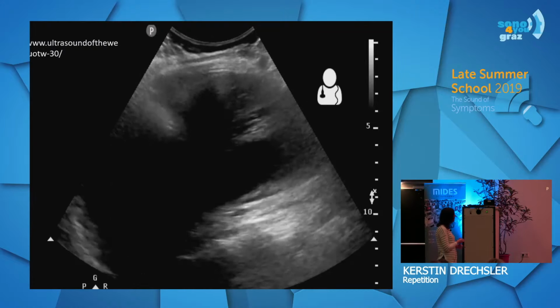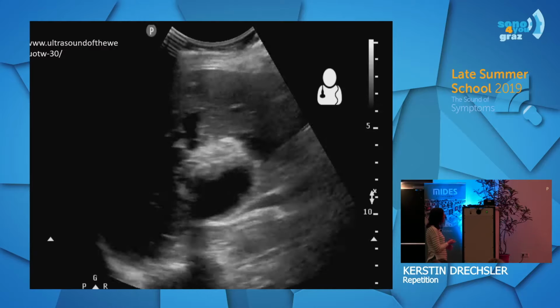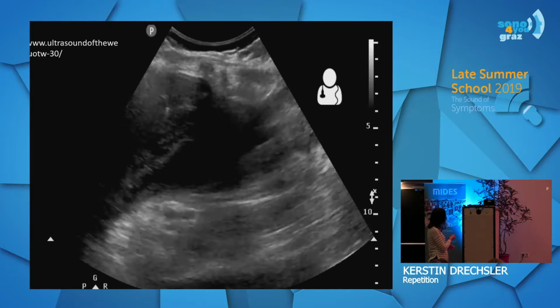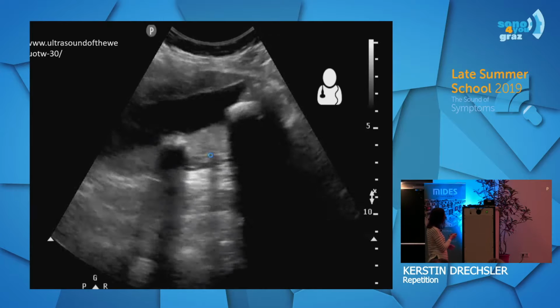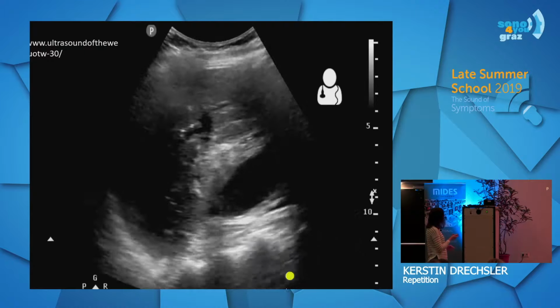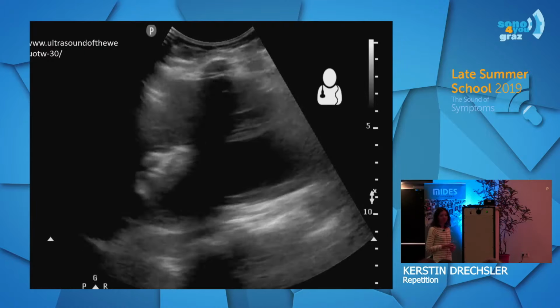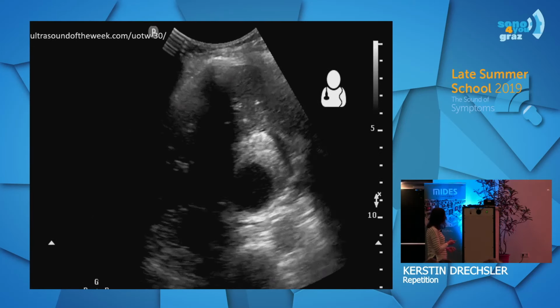So you actually see a massively dilated structure in there. It's pretty edematous. There is probably a fecalith, or who knows, there arises some acoustic shadowing, there is some edema, and the mucosa is pretty swollen. So it should be a case that is pretty straightforward, but what's your diagnosis in that case? We can see once again the horizontal plane.